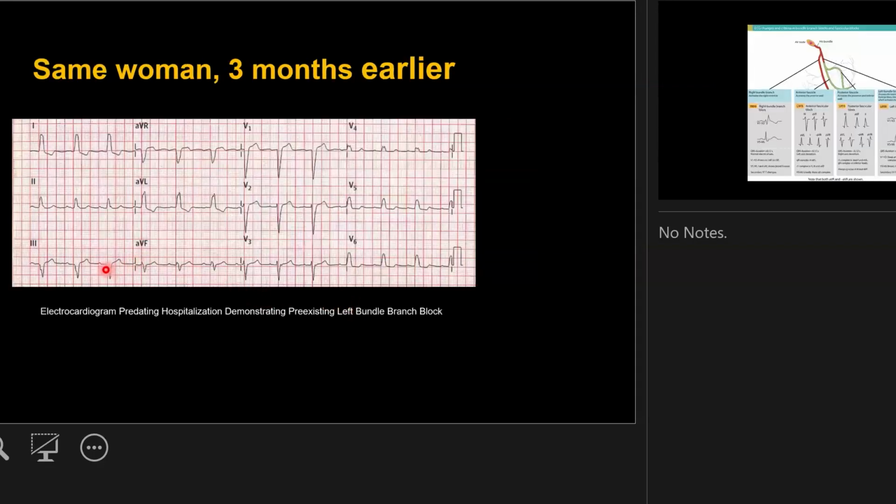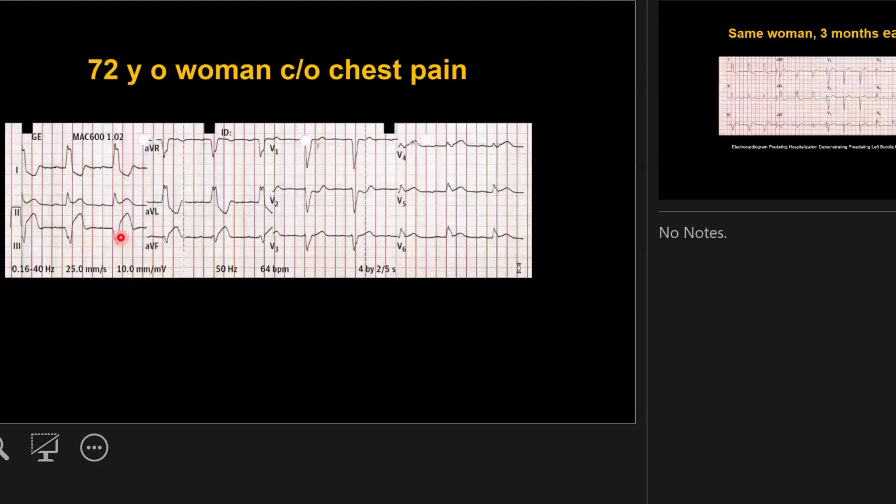See, you see here. So this is more normal. This is down. This is up slightly. Okay. This is down. This is up a lot. But that's harder to differentiate, except when you look here, it's much more obvious that it's going in the wrong direction. Yep. Okay. Yes.